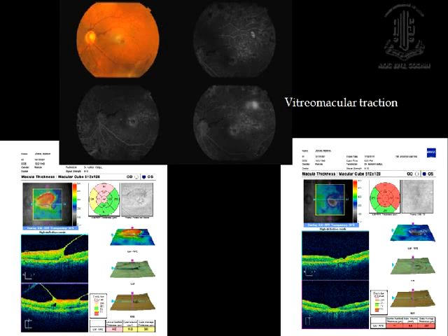One can have patients who have vitreomacular traction. Like this is a patient who I have myself been following up for the past 5 years and have never advised her surgery. And this time when she came, she developed a little bleed, and I said, let me do an OCT and see. And the OCT showed that the patient had a vitreomacular traction. Patient's vision was stable for the past 4 to 5 years at 6/36.